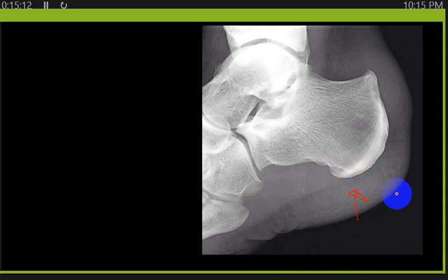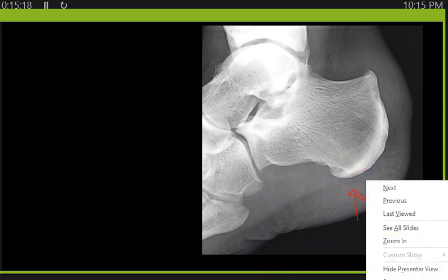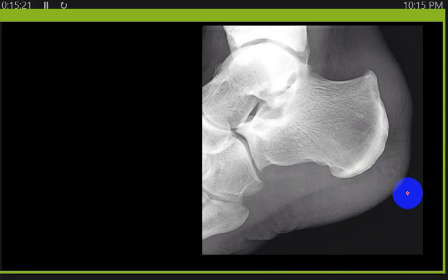If I told you this is not the pathology, look for something else. You see the bump here. Which tendon is inserted here? Achilles tendon, very good. You see some soft tissue swelling at the insertion of the Achilles tendon. In other words, the Achilles tendon is thickened. Tendonitis. Okay, and what is this here?